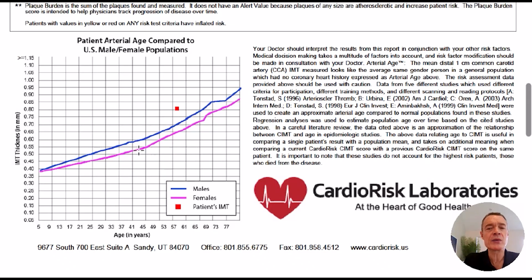So what I did with AI is I said, these are CardioRisk sort of general population cohorts, minus the dead people, minus known cardiovascular risk people, but they do include healthy people. Go find population cohorts that are predominantly just healthy people, and plot my values on that chart.